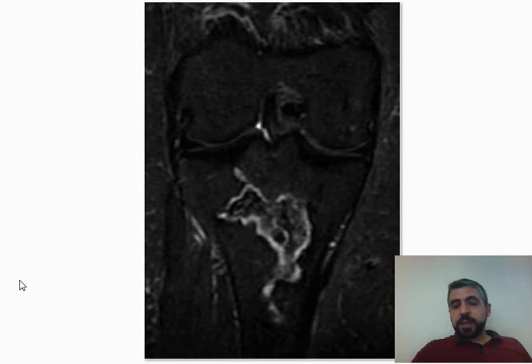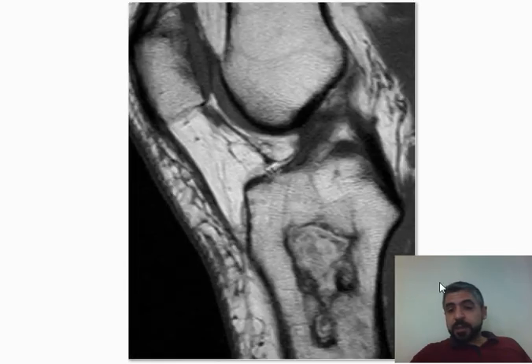Again, you can see this here is the main differential diagnosis of enchondroma. When you see enchondroma, what other kinds of differential diagnosis might look the same? In this case, it is bone infarction. Bone infarction, you can see it has a little bit irregular outline, an undulating line, and the line appears as hypo-intense periphery and hyper-intense centrally.